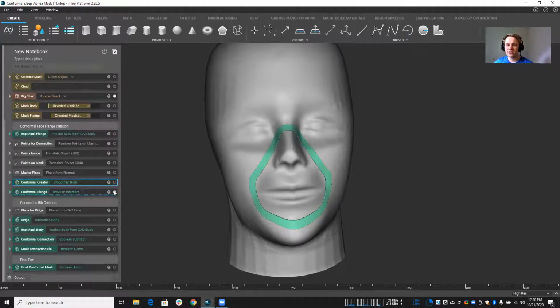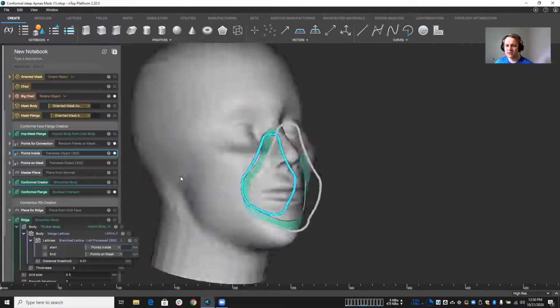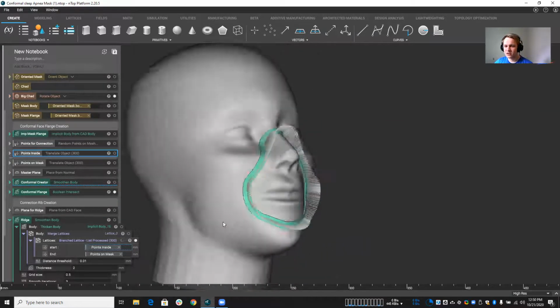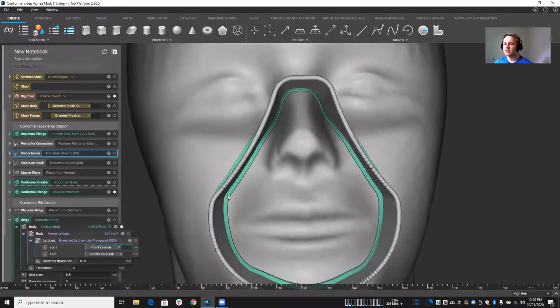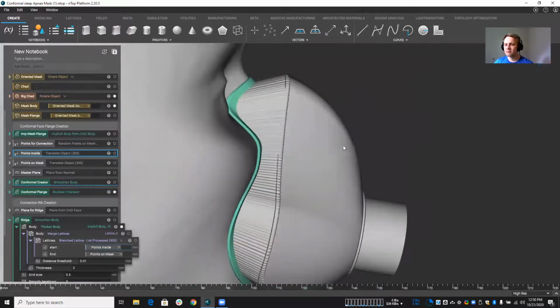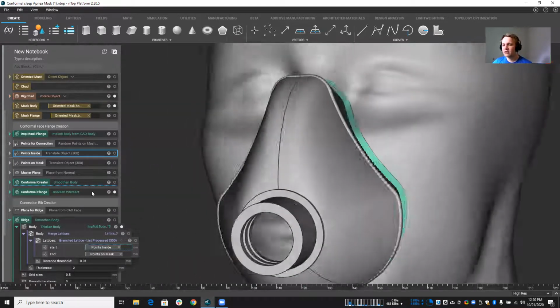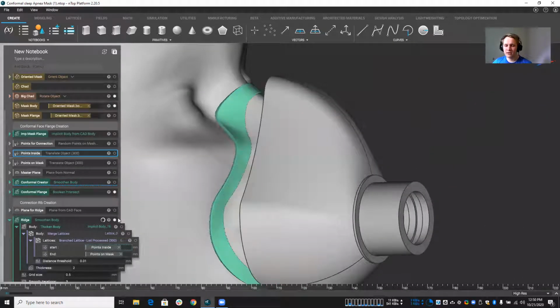Well, we can take those points again, and in a very similar way, I'm going to take points inside, points for connection, take these points, and with a slightly smaller diameter, I can do the same thing. So I can take this branch lattice trick and give it a little bit of thickness, but a much lower thickness, right? Because I have that part on his face. I need to be able to connect it back to this mask body. So that's what I'm working on doing now. So I have these new parts that connect to the flange on his face. I need to connect to the part. Doing the same trick, I'm going to smooth that out. Should have rendered that ahead of time, but that's all right.